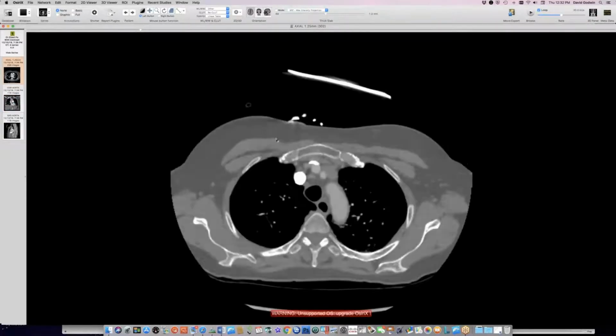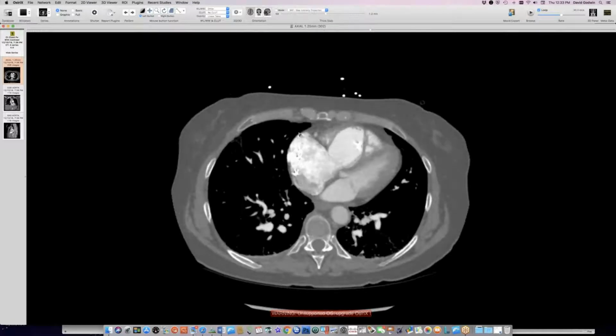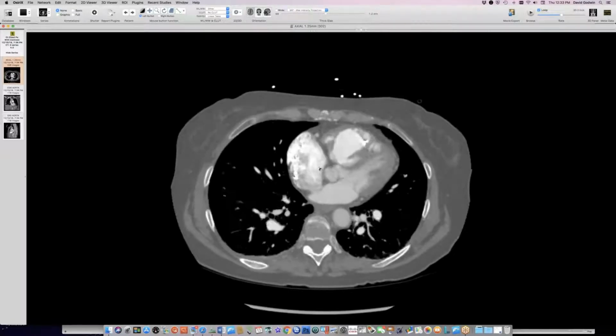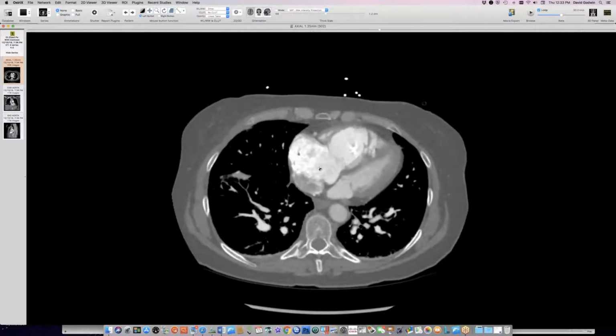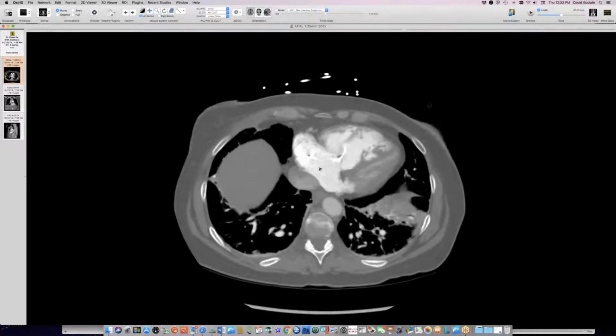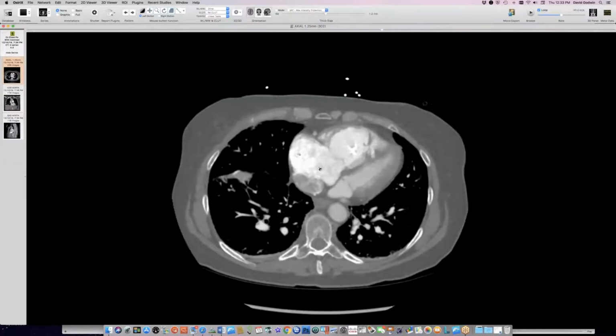So if the ventricular pressures are high, then wouldn't we expect more dilation? That's a pretty big right atrium. That's big enough. The RV's hypertrophied too. This patient definitely has pulmonary hypertension. The valve is closed, so the patient's in systole.